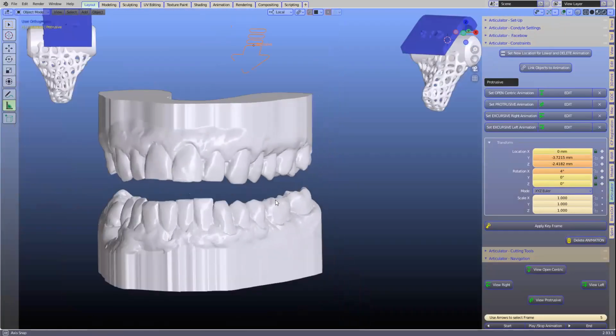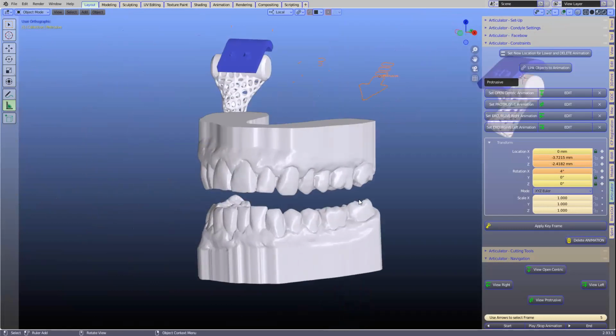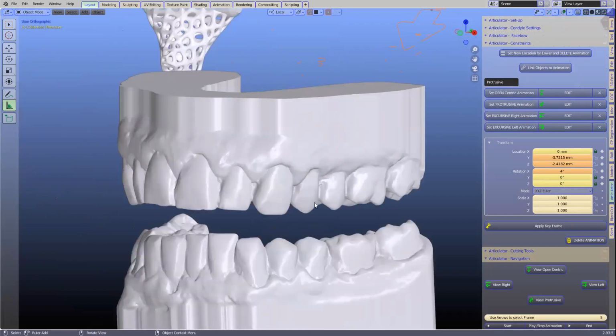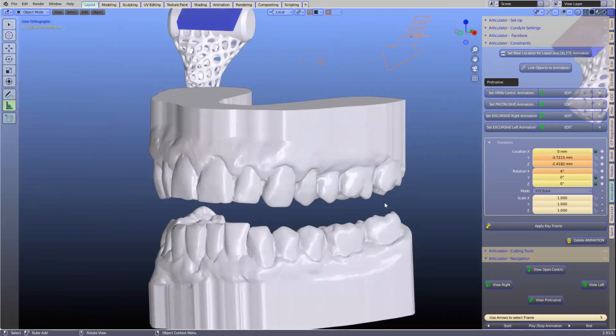100% correct. But this is something I've got to emphasize: we need enough space for both layers, plus the cut, plus the 0.1 or 0.2 millimeter offset that we're going to be creating. So I've set this to 4 degrees. This is trial and error depending on how thick.